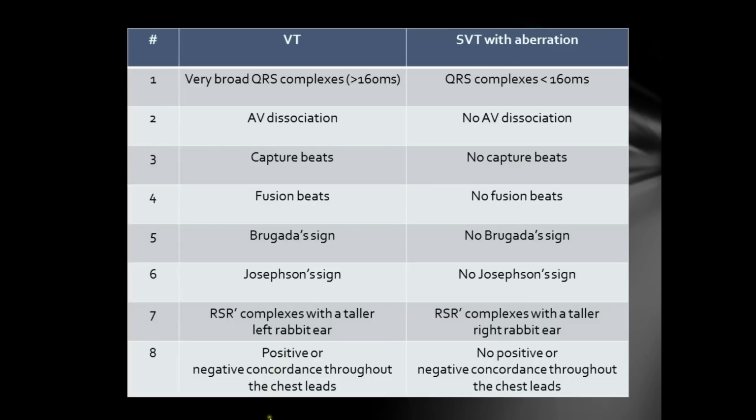And this is actually the first step in the Brugada algorithm to diagnose ventricular tachycardia. The bottom line is that you're not supposed to have RS complexes. An RS complex would have an R wave which is positive, an S wave which is negative. But again, this is not always the case, as some ventricular tachycardias do have RS complexes.